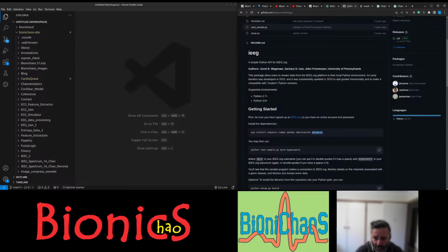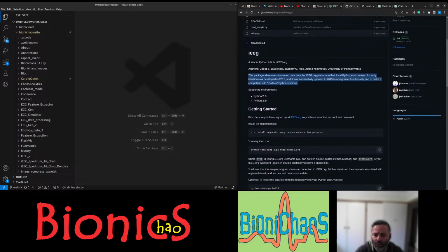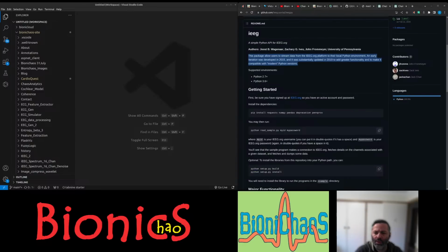So it's good that it's old data. It's been sitting there for quite some time. So I can't read properly. Wrong button. Developed in 2015, and it was substantially updated in 2019 to add greater functionality and to make it compatible with modern Python versions. So we have an active account and password.